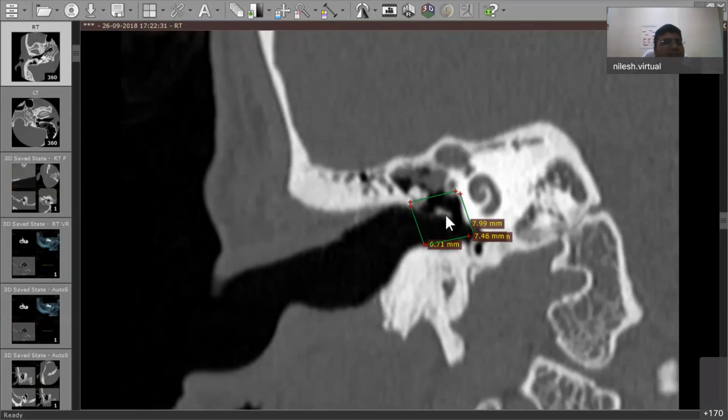So how to differentiate? Get the contrast scan done and non-echoplanar diffusion weighted imaging done. Why to do that scan in this particular case? Because clinically you are not able to judge what it is. Suppose if I have seen the white mass in the middle ear, I'll say it is congenital cholesteatoma. Suppose I have seen the smooth globular bulge here, I would have said that it is the facial nerve schwannoma. But clinically, you are not able to assess which pathology it can be. So in that case, you have to get HRCT temporal bone plus MRI temporal bone with contrast with non-echoplanar diffusion weighted imaging.